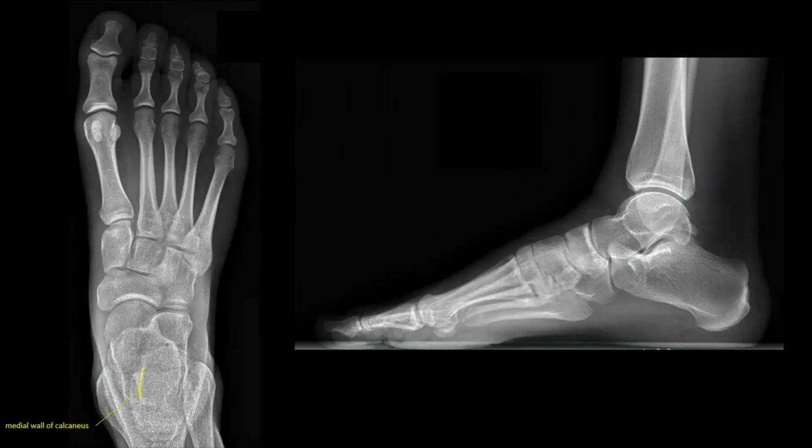On the lateral radiograph, the anterior borders of the malleoli are identified. A line angulated 17 degrees posteriorly towards the heel is drawn that touches the anterior border of the lateral malleolus. This line runs parallel to the X-ray beam of the dorsoplantar radiograph.